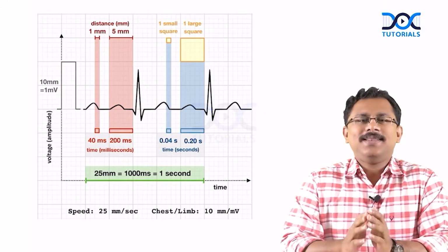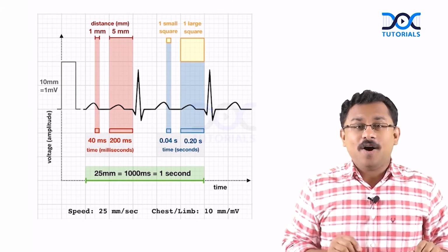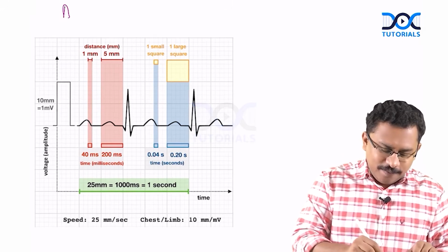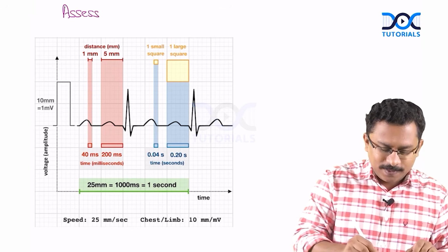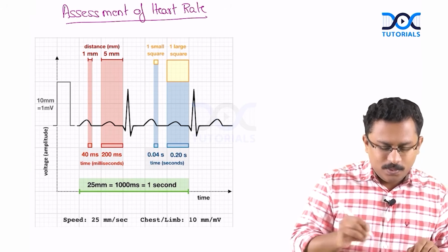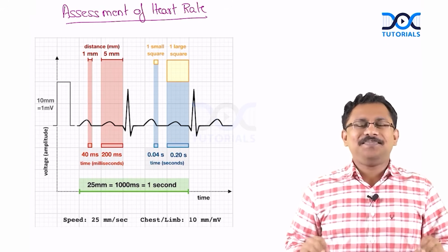The next step in the interpretation of ECG is the assessment of heart rate. Assessment of heart rate is actually very, very simple.